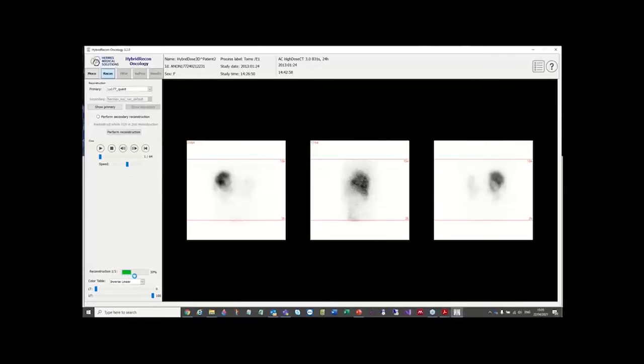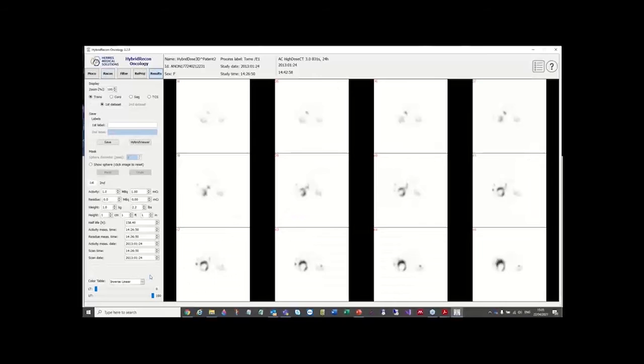So here it goes with its almost 100 iterations. Wow, so fast. So yeah, that's a really big improvement in time for doing those reconstructions now. But no time for a cup of tea. No, and once again, that's because of our graphical. We use the GPU to carry out these processes, so that's why we can do these things so quickly.